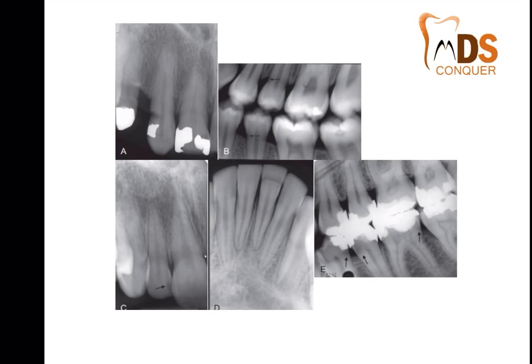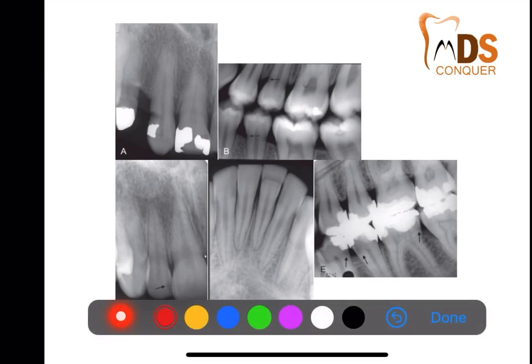So first, if you see this radiograph, there is a proximal cavity, right? This proximal cavity is nothing but dental caries. So there is a proximal caries seen here. If you see, there is already a filling or a restoration there. Below that you can see a radiolucency. So this is the proximal caries, probably secondary caries. This is quite easy to identify.